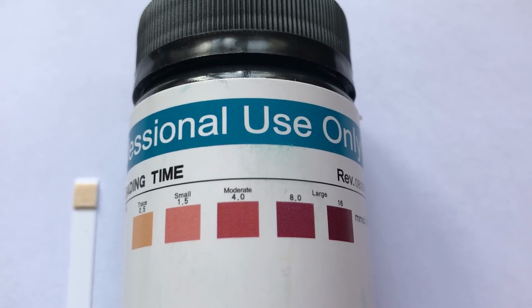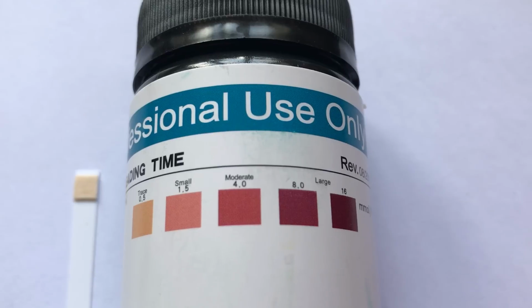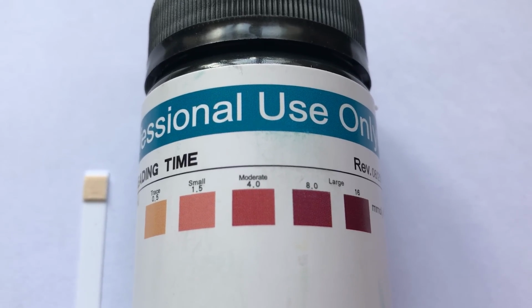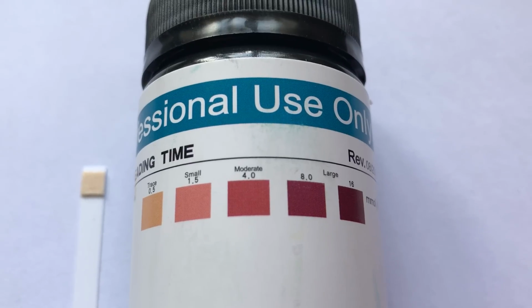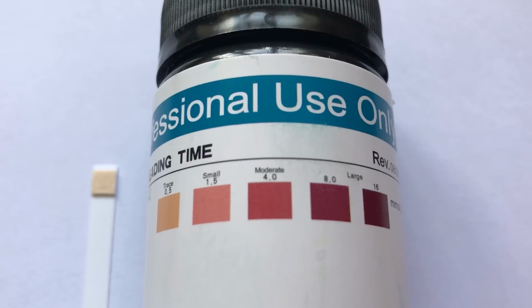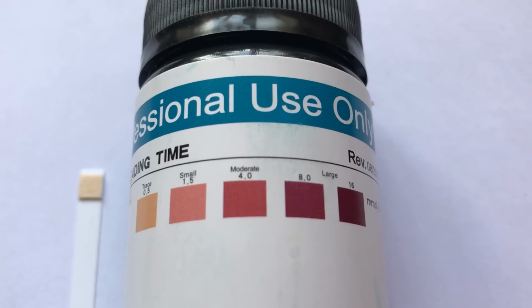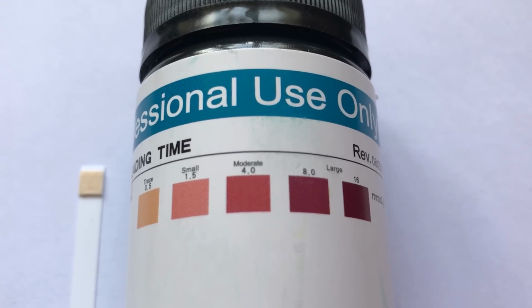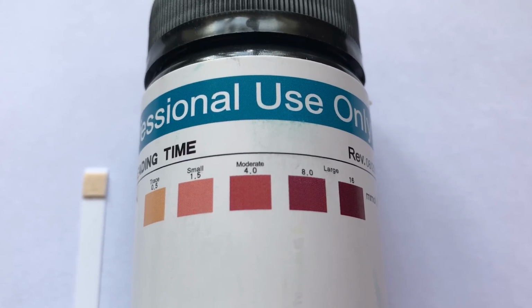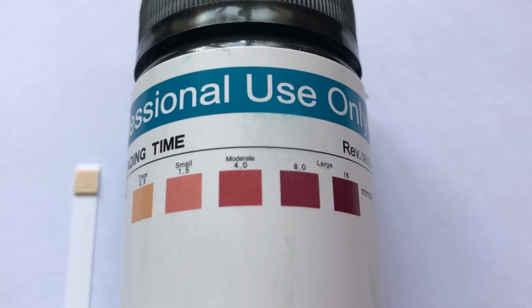Well, in this video, we're going to run you through what the indicators on the side of a urine ketone test strip relate to, and the significance of these levels when you are dieting. Principally, this advice is intended for people doing low calorie, low carb, high protein, moderate fat diets, not necessarily ketosis diets, but Atkins and similar weight loss regimes where you're trying to reduce your carb dependency and increase the breakdown of fats, resulting in ketones in the urine.